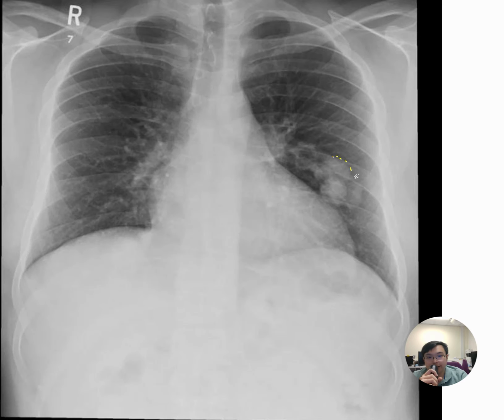So first of all, it has a lobulated, well-defined margin, very likely to be intrapulmonary in position. However, there are also some tortuous prominent structures radiating from the left hilum. So very likely there are some prominent pulmonary vessels communicating to this lesion. And this lesion is likely to be vascular in nature, which looks like vascular pouches, but we do not see definite communication to the pulmonary vein, but at least we can see the arterial portion.